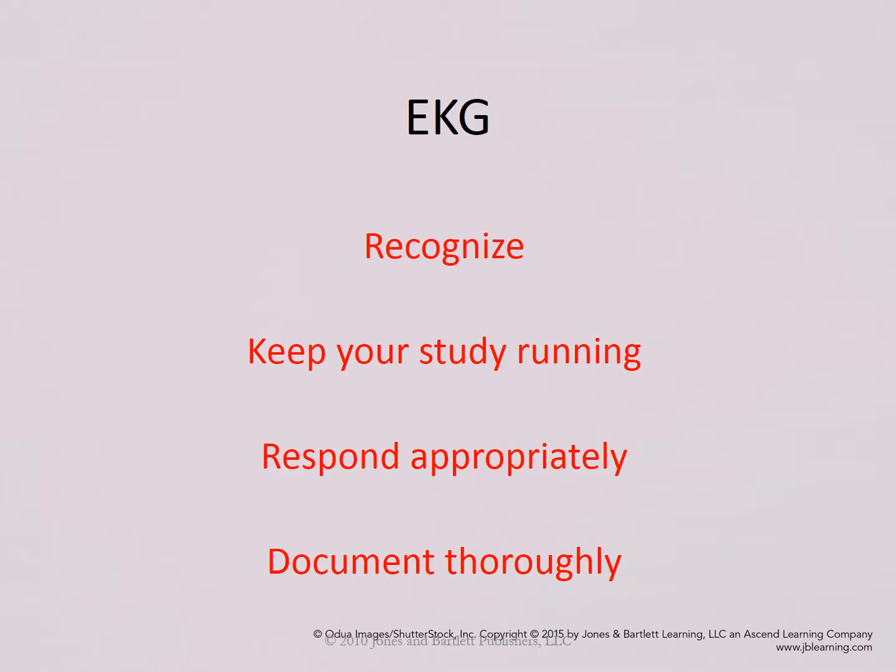This PowerPoint is going to review the different rhythms of EKGs. Your main focus is to recognize the various rhythms. Remember, if you are seeing these in your sleep lab, you're going to keep your study running, respond appropriately, and then document thoroughly. So let's get started.